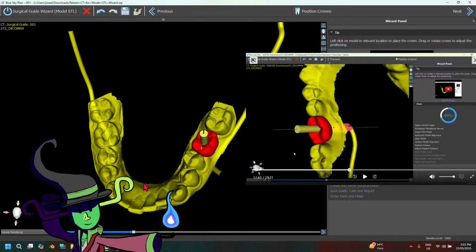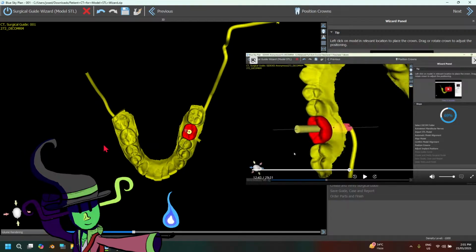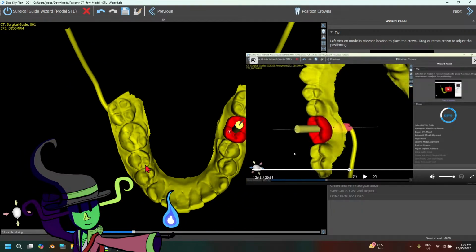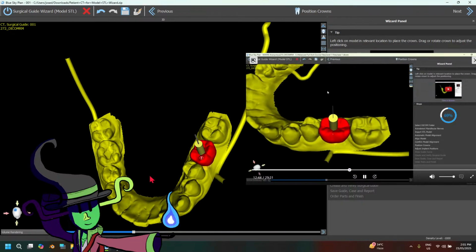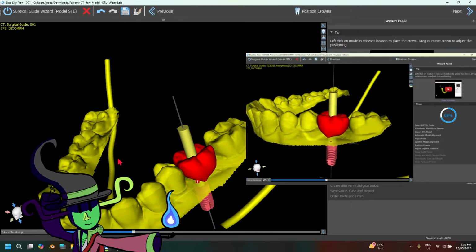Alright. Let me see. Yeah, I guess so. Oh, wait, is that a filling? Just noticed this cavity here seems too big to match anything that a normal first molar would have. Now you'll notice if I put my mouse on the tooth, I'm not clicking anything, I'm just hovering on it, a widget does pop up here. So if I look at this and I think I'd like to make a little bit of a change.